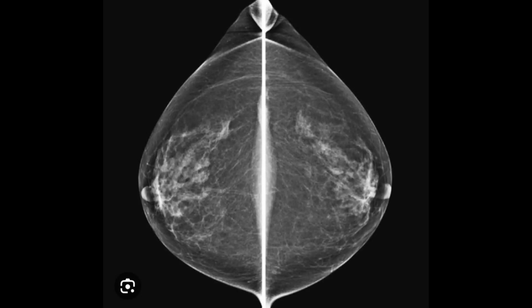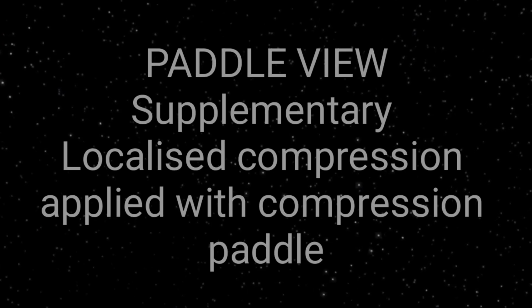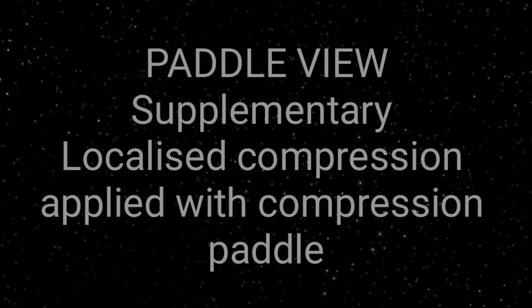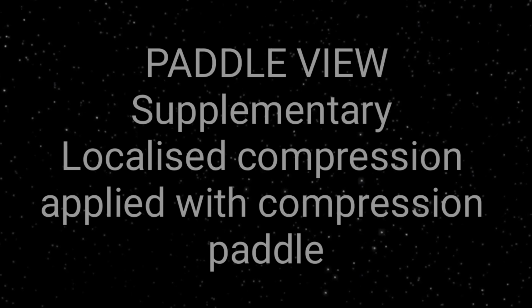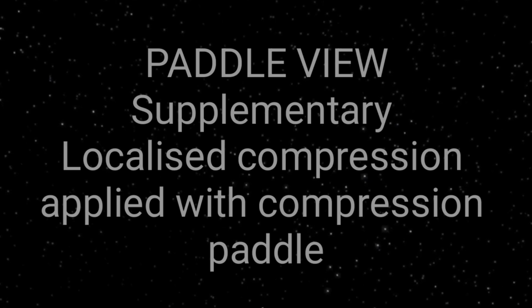The only point with this craniocaudal view is that you cannot appreciate the axillary tail of the breast. This is the only limitation of the craniocaudal view, but for that purpose you have to pull the breast forward from the anterior chest wall, and the second thing is you have to compress the breast from above, and the nipple should be in profile. So this would be the craniocaudal standard view. Besides the craniocaudal view and MLO view, these two are considered the standard views for mammography. There are some supplementary views which you can use where necessary.